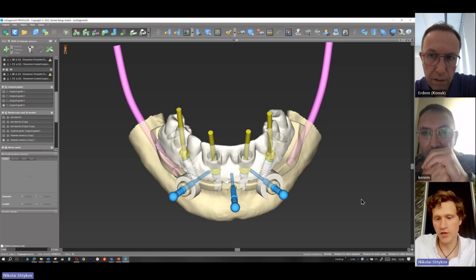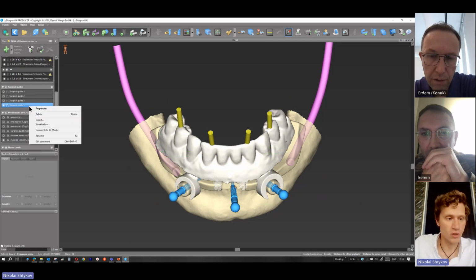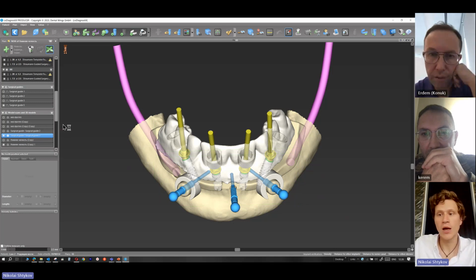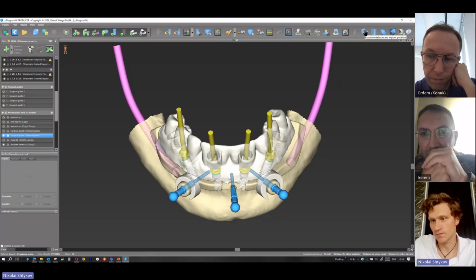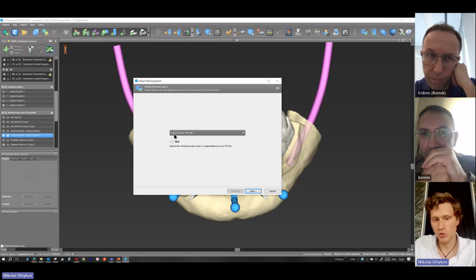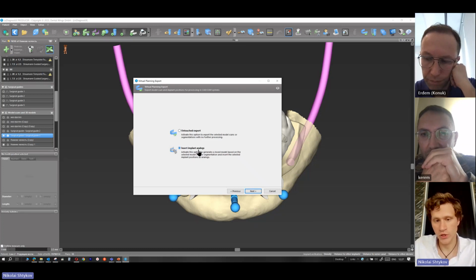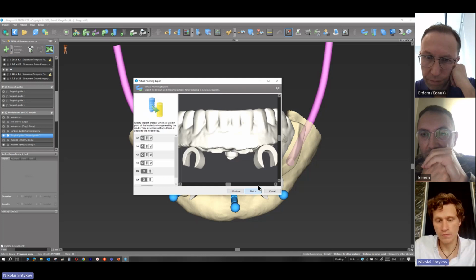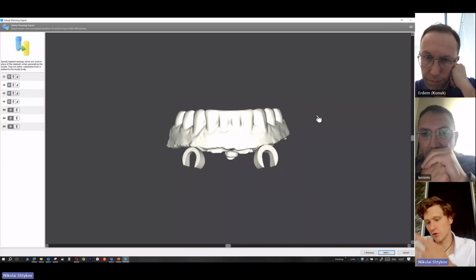Okay. Surgical guide 5. Now you can convert it to 3D model. Now here's this, and after this you have to go to export model and prosthetics. You need to choose STL, insert implant analogs, surgical guide 5. This is one of the ways.